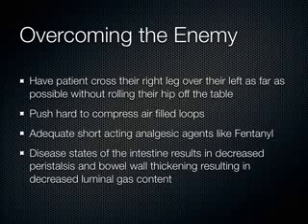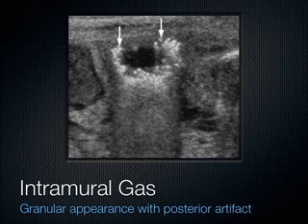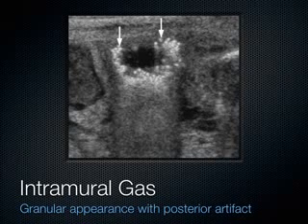So abnormal intestine, like that pseudomembranous colitis picture you just saw, we can really see the outline pretty well of those loops of bowel. When we have gas inside the wall of the bowel, this is a very abnormal condition. This tells us that an infection has progressed so far that we're getting gas inside the wall of the bowel. We can see this granular appearance intramural. Mural means wall, as opposed to intraluminal, which means the lumen or center of the bowel. Gas there is normal, but to see it in the wall is always abnormal.